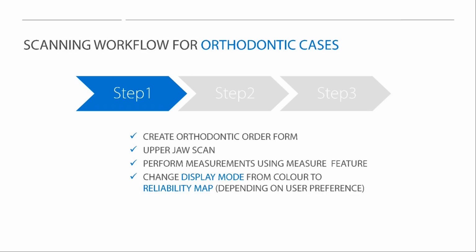So 3 steps, all the scanning workflow for the orthodontist. First, we create the orthodontic order form, which is important in order to send the case through Medit. Of course, you can export your case from our system and send it with an email or with any other means. But we always highly recommend to use Medit because it's simpler, faster, and of course also the data are safe and encrypted.